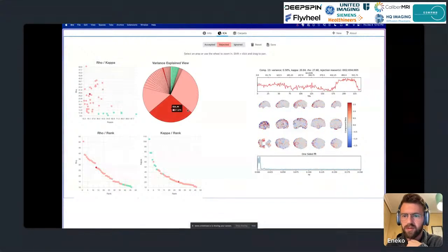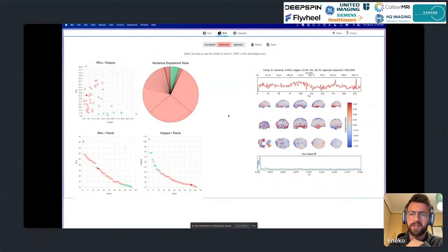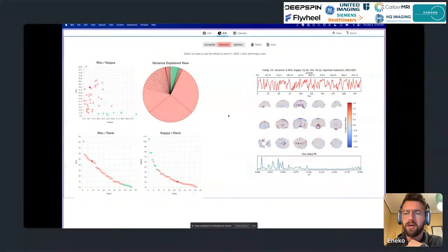Yeah, it looks like TEDANA did a good job at rejecting, which is usually the case. The ones that TEDANA rejects are usually a clear reject, and it would rather ask you to reject manually the ones that TEDANA is not sure about.